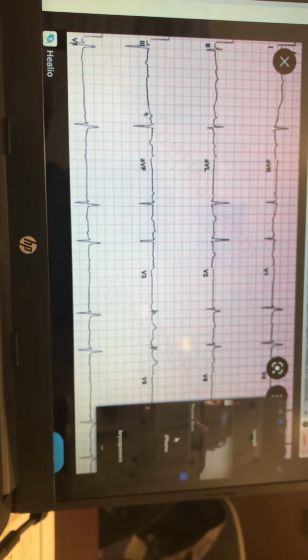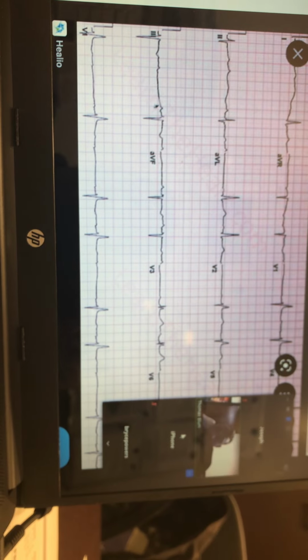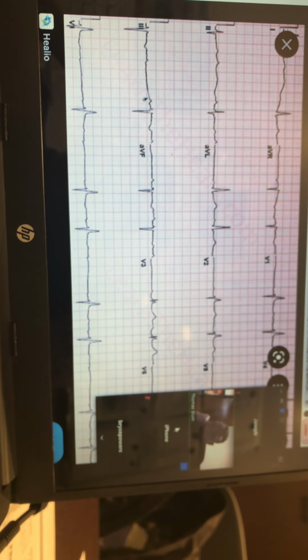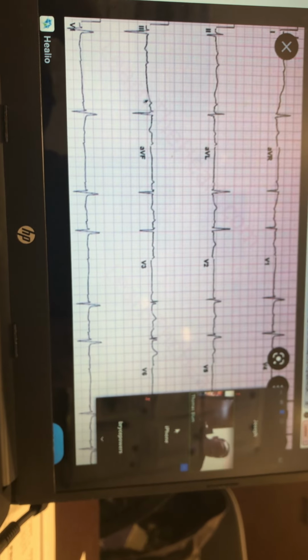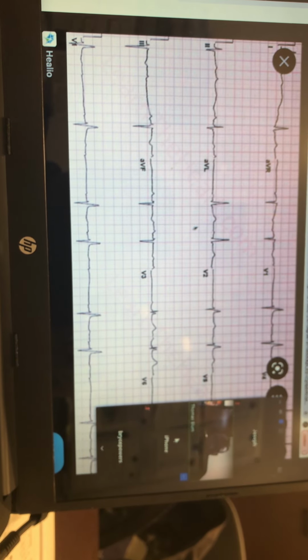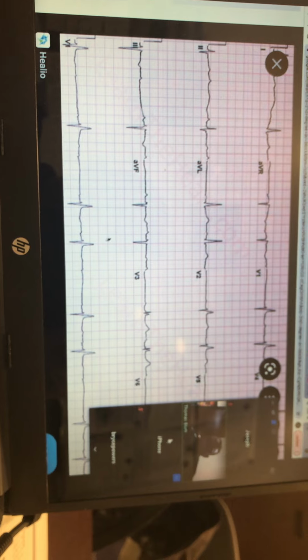So within second degree type 2, we're definitely worried about a bradycardic rate. And I'm also worried about ischemia, right? Is this ischemic injury induced? Is this an MI induced dysrhythmia? So being that I've got a 12 lead here, I want to continue on to identify if there's any aberrancies, which I have a narrow QRS, so there's no aberrancies here. I don't see any ectopy, right? I've got no abnormal beats, whether it be a PAC, PJC, or PVCs.